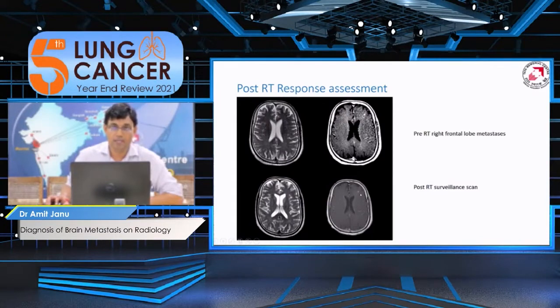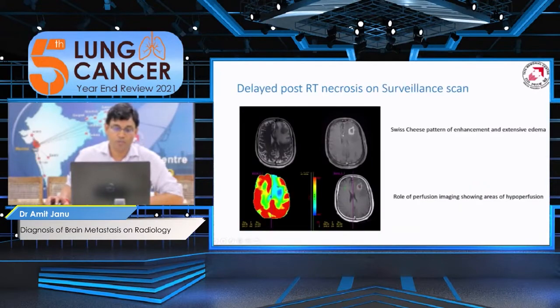has increased. So just immediate post-RT, there could be radiation-induced changes or post-RT changes. You can see that if it is not showing necrosis, then you have to follow it up. So this patient was followed up, and after 2 years, it becomes symptomatic for the brain lesion.